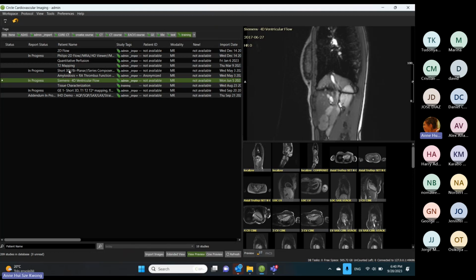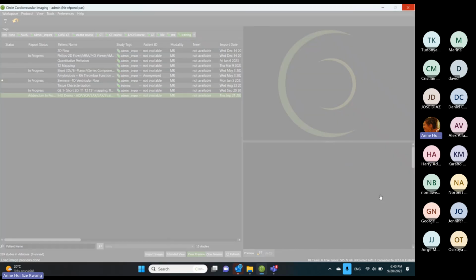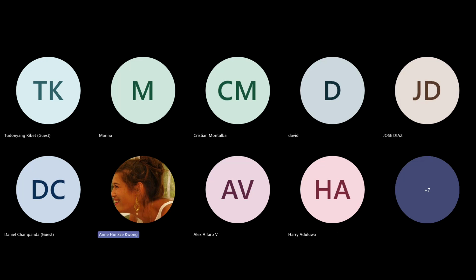You can use directly the map of the MRI, okay, and you will have the AI apply, and you can go over the CV if you want. So it's done completely automatically. I will show you in a minute, but yes, absolutely, you could have color maps as you asked me.